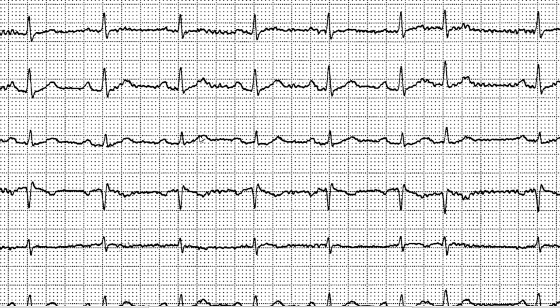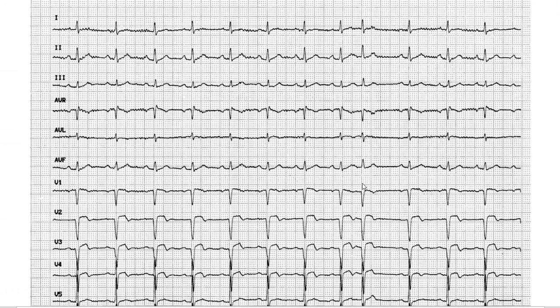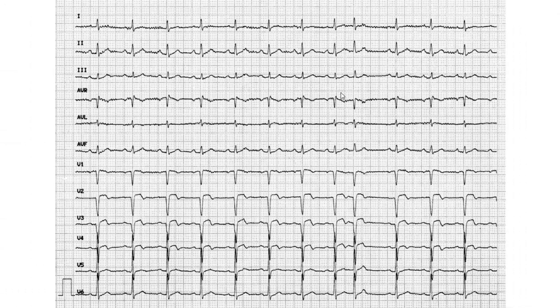This is not fibrillation. This is the patient's muscles twitching and the patient moving around. This is that point that we mentioned. So this is actually a perfectly normal patient with a singular extrasystole. Point 1, we say regular with an extrasystole, and you mark this. I think you do mark this as a pathology according to the ECG script, but keep going. It still counts as regular.